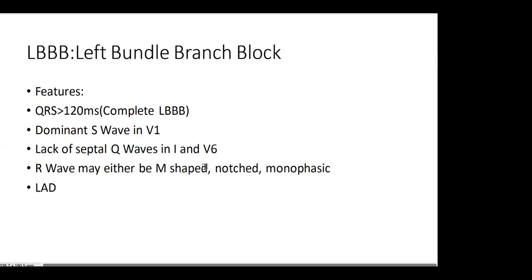On the last ECG, the patient had a normal ECG, and spontaneously you see an LBBB, and they have unspecific clinical symptoms. Some of them just have a stomach ache, some just have a backache, but then you see an ECG that is suggestive. Anyway, when do we have a left bundle branch block?